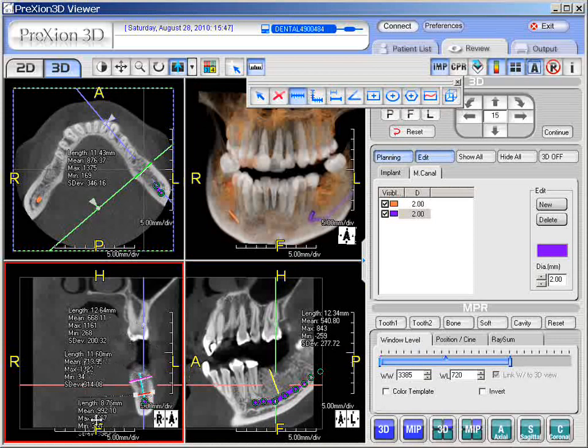And then here for the apical region, you're going to subtract 2. So you've got 8.76, you've got 6.76. Okay, so you put maybe 3.5, let's say. And then of course you've got your length, so you could put maybe 12.3, subtract 2 to 3, maybe a 10 or a 9 millimeter length. So you have the measurements beforehand, which is a nice feature.